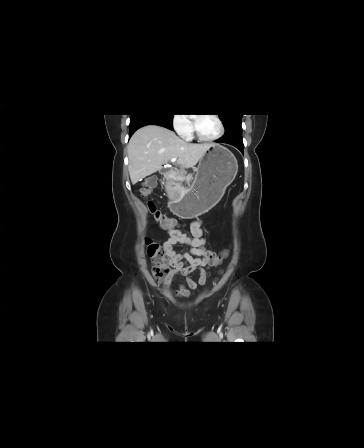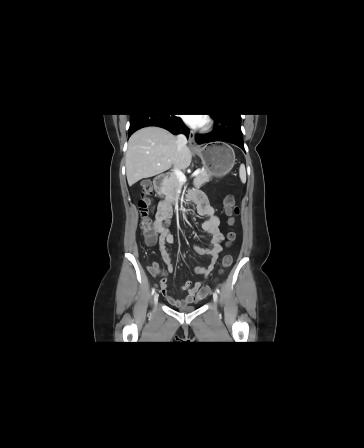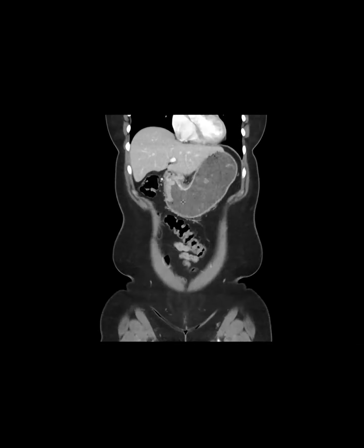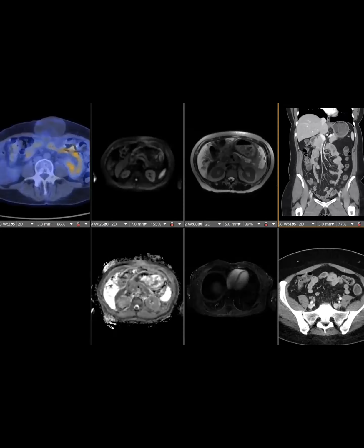So my teaching point is something else. Anyways, there's the debate between omental or intraperitoneal carcinomatosis versus perigastric nodes. Didn't you bring that up before? Oh, staging. If it's spreading into the omental space directly, then we don't call that omental spread. There are about 20 or so nodal stations along the stomach that are all the regional ones.